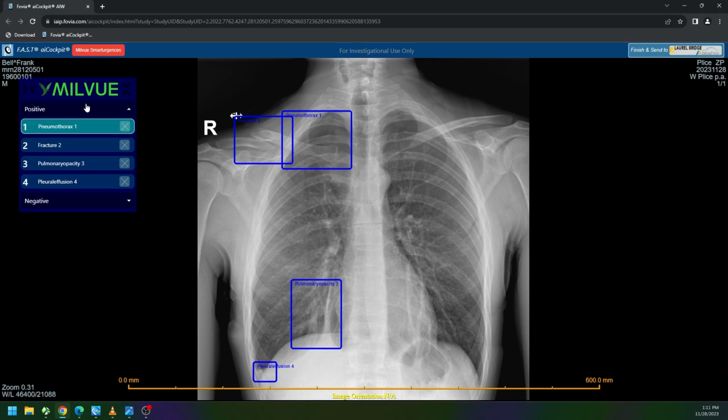The Smart Chest algorithm annotates the suspected abnormalities on a copy of the image using a standard known as DICOM Structured Report, or SR. Note the paradigm here. In this case, the radiologist can modify AI results before they get into the final report, if they choose to do so at all. With DICOM SR, you can move through the lesions individually and accept or reject each lesion.